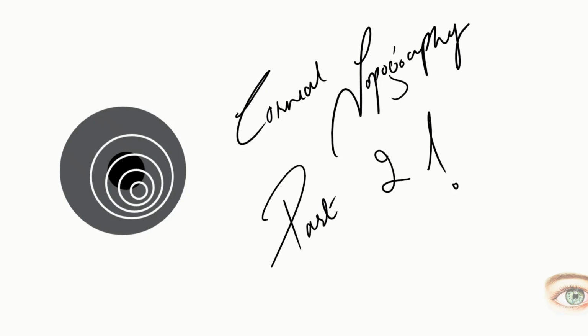In this video, we are going to discuss different corneal maps and how to interpret those. So let's get started.